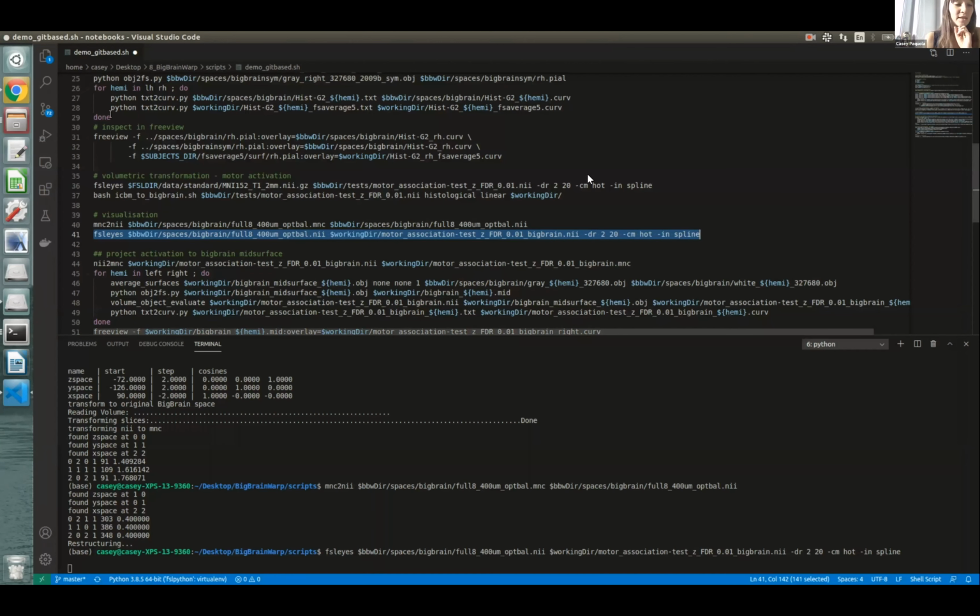Okay, I think there was another question. Oh, good. Okay. So I think one of the real advantages of using BigBrain, at least personally, is using the surface data, because you could use these staining intensity profiles. So even if you had, for example, task activations, you've moved it to the histological space, the next step might be to go from the volumetric space to the surface space of BigBrain. So we can do this pretty straightforwardly using some Minc tools as well.